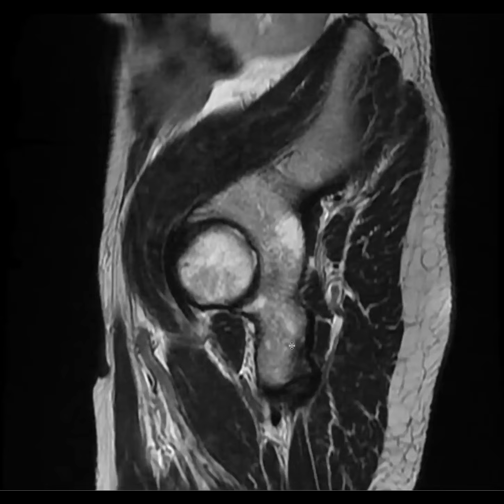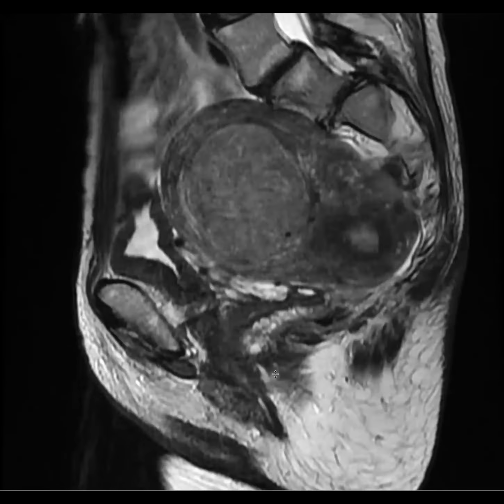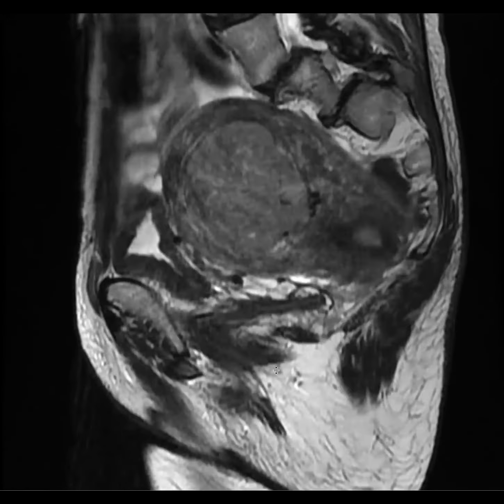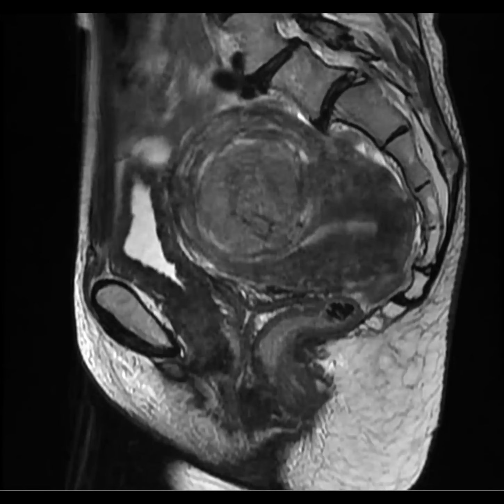Show the T2 again, just for one last thing. If you didn't get that one area, would you have called this probable fibroid or no way? No, because of the T2. Because why? The T2 looks suspicious. Intermediate. And abnormal. Yeah. Good case. Agree. So for anyone listening, you can check out the radiology paper by Heinemann et al. in this past year. It was a consensus statement about leiomyoma versus leiomyosarcoma, and they have a nice little algorithm there that Nelly just led us through.